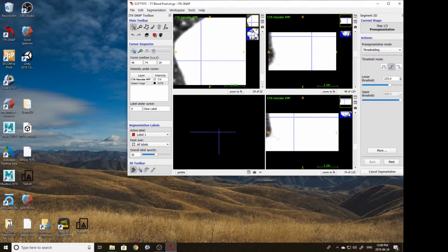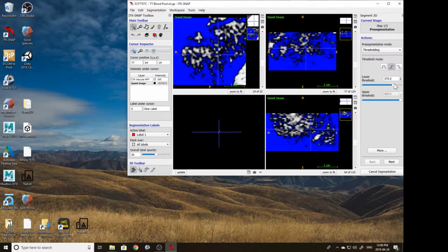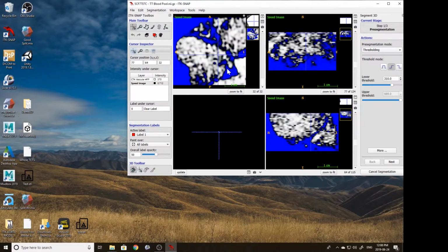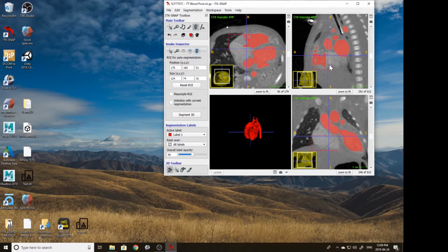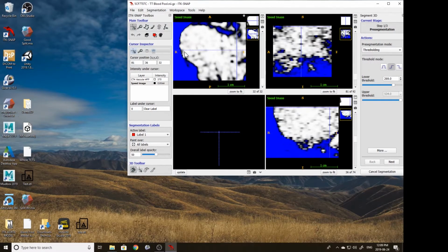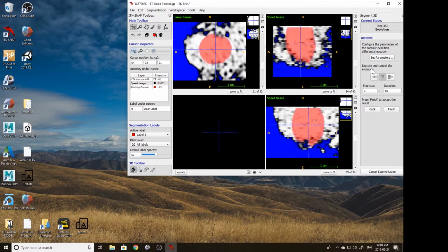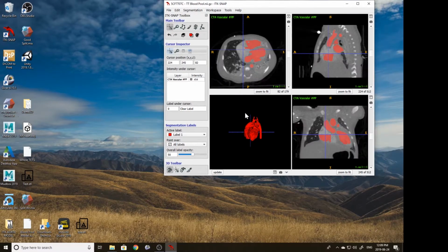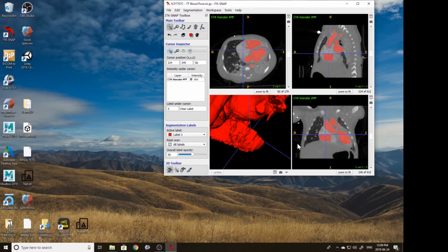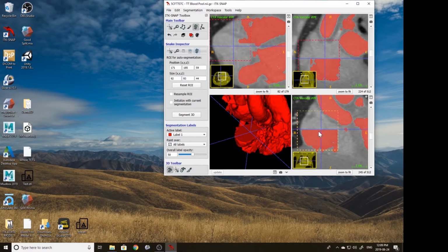Perfect, we're gonna get that atrium. As you can see here, if I go down too low, I'm losing a lot of that detail. So this means that I'm gonna have to actually make my ROI box a bit smaller. Alright, this is a ventricle. Alright, there we go. It is the atrium. I don't remember. Anyways, we're making our way through here.